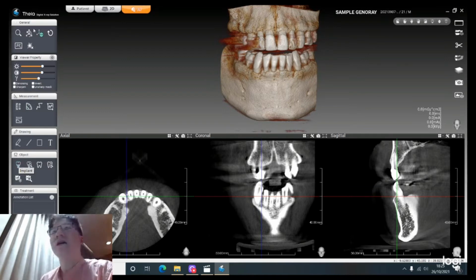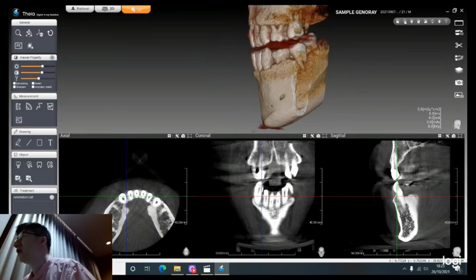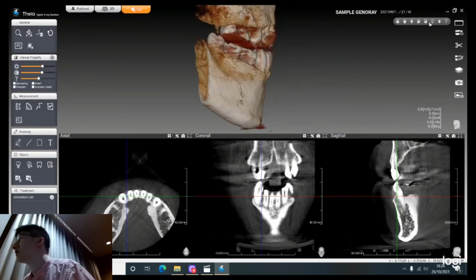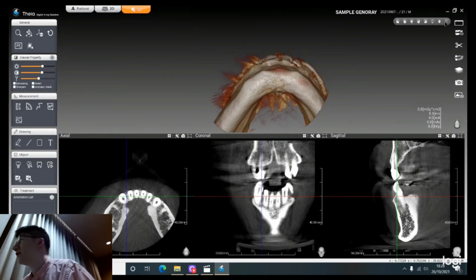Okay, and that's just some basic ways of manipulating the pictures and giving yourself little notes here and there. That's quite standard. Let me talk about the menu on the right here. There are 7 ways to view the picture quickly, to rotate it quickly. That's the side, the front, the side again, more side, and this is looking from the back, from the top, and from the bottom.